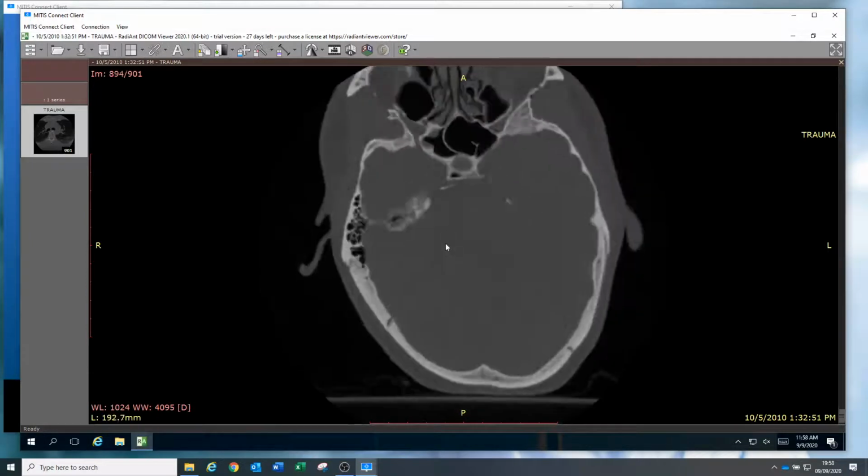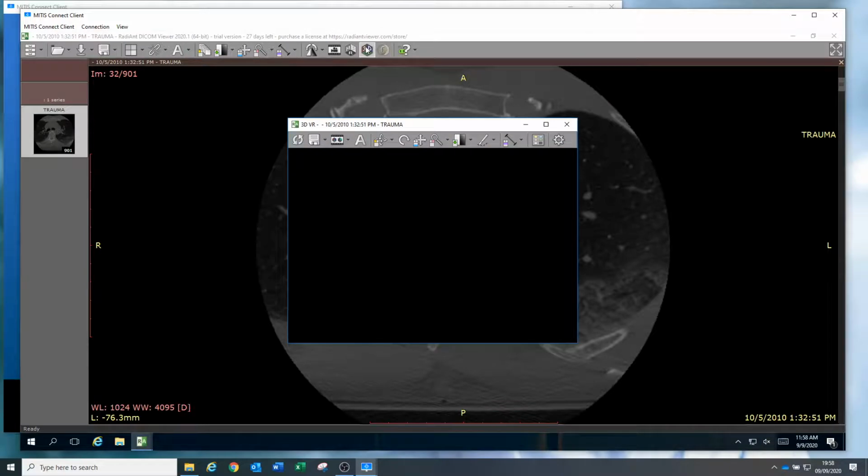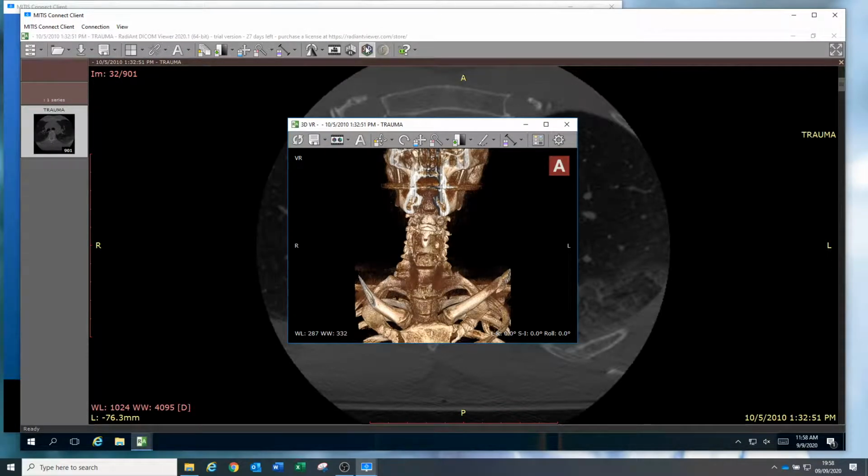We'll now go and start 3D volume rendering of the CT scan. So what you see in front of you is the 3D volume rendering of the top part of the body. And what we'll do is we'll take a rather unconventional approach. Instead of putting in all the nice lossless environment, we're going to take it off, and we're going to also take off our NVIDIA vGPU graphics agent and highlight what a lossy image looks like without using the nice features.